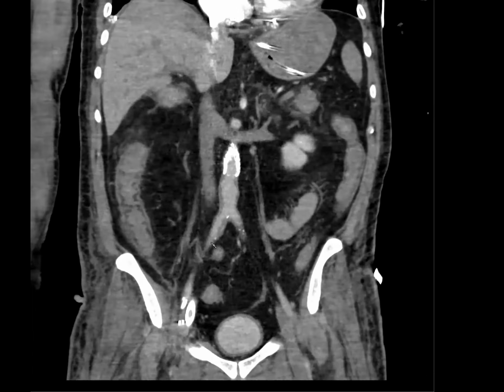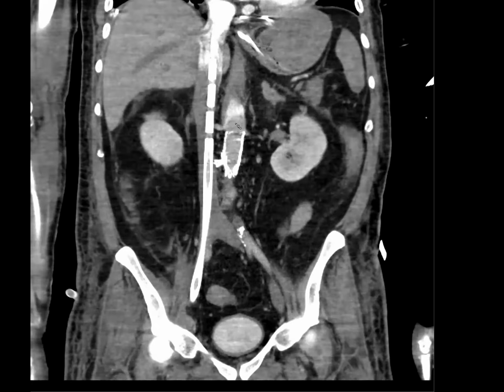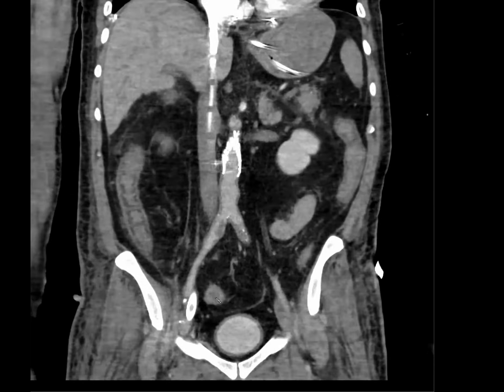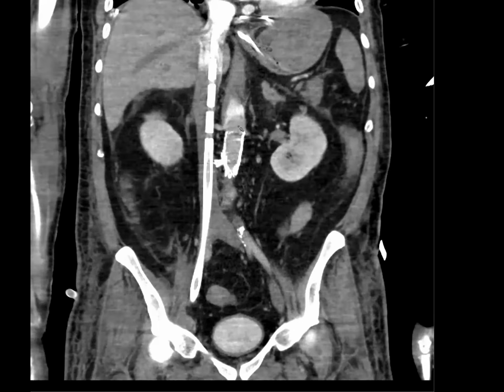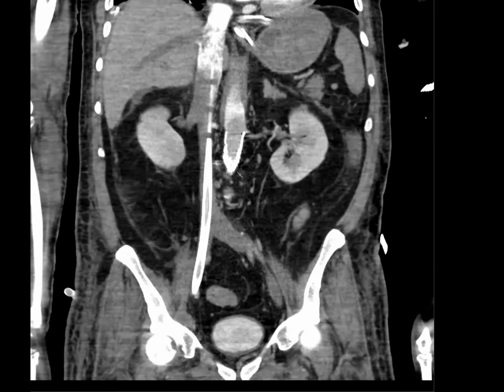And then this blood is jetted into the aorta. And so the contrast enhanced blood is mixing with the now newly oxygenated blood that's coming up the aorta. So this is a known artifact that you can get if you're on ECMO, when you get weird mixing of blood, because you're basically mixing blood that's pumped out of the heart and blood that's being pumped back into the body. So I thought that was really cool because we were like, did they just thrombose off their aorta? Like, what's going on here? But this is actually an artifact from ECMO.